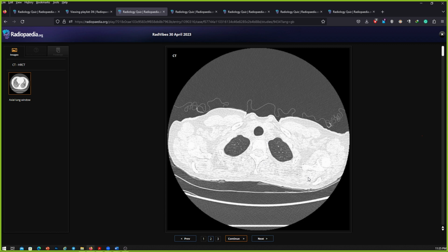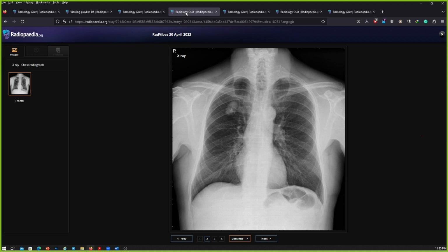So what is UIP? Usual interstitial pneumonia. Okay. In my routine practice, I will get the further history from the patient and ask if there is any previous imaging available for comparison. Since I can see that there is a dilated esophagus and most likely this patient will have a history of dysphagia as well, I would ask to get the further workup for scleroderma, including the radiographs for hands.